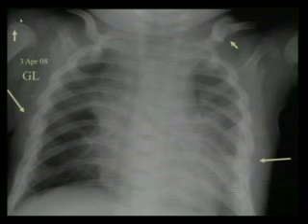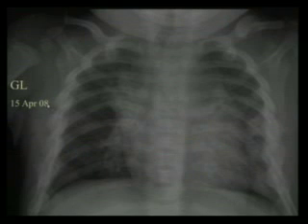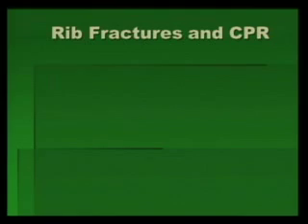Child abuse is an accusation, and we just know that the baby's being abused by somebody. We don't know who. So it's scary to go, but these are the acute fractures. These are the healing fractures. Here's later on, there's more callus, more healing. There's still that fracture, still the fractures here.